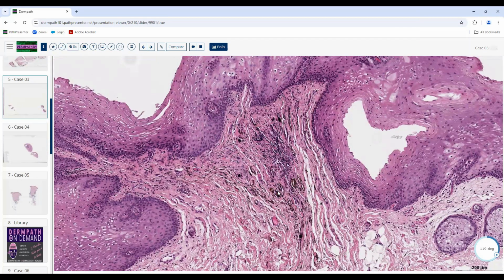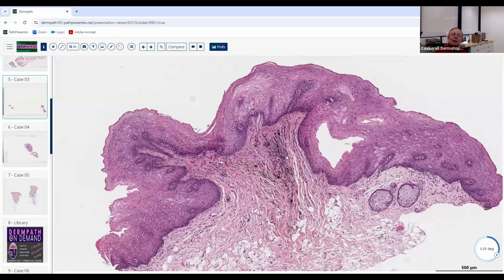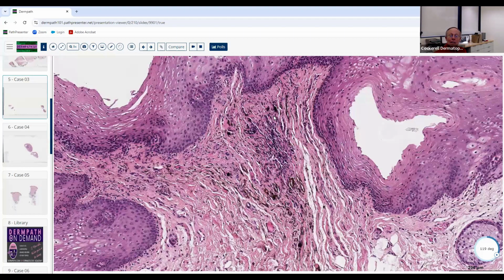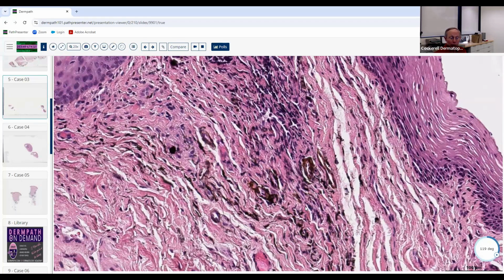So you have to have a differential diagnosis of what that material is. What do you think the dermatologist's number one differential diagnosis was when they took this biopsy in the clinic? Like a mucosal melanoma. Yeah, exactly. They had one differential, rule out melanoma. So now you see something dark, and you've got to decide, could this be melanoma? Because that's what the clinician puts down on the requisition slip, rule out melanoma. So you've got to rule it out. So how are you going to do that?